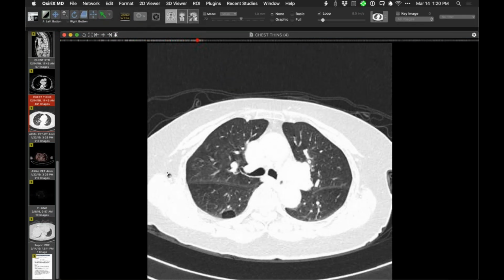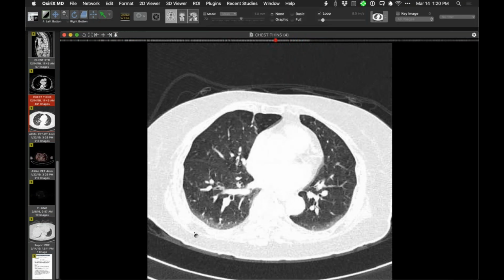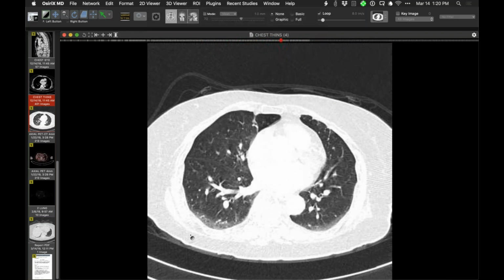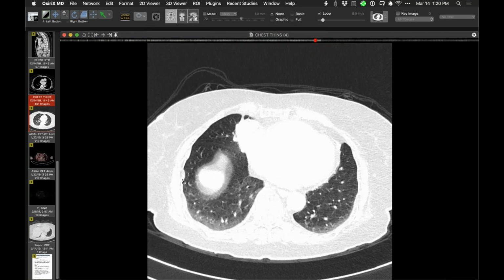The lungs look all right. There's one cystic space. If I saw more of those, then I'd wonder. But I don't know what to make of just one little cystic space like that. There. I think she'll be fine. She's an older person.